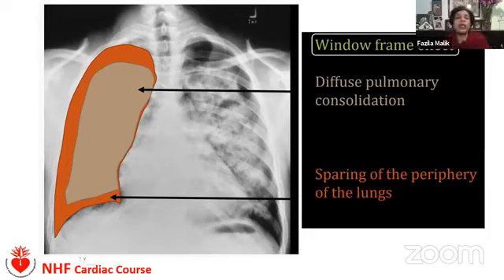One important thing about X-rays is that we really need to correlate these with our patient. In our day-to-day clinical practice, correlating an X-ray with our patient's history and other findings is very easy. In a way, during examination, it's a bit unfair because we're just being given an X-ray and we're expected to know what the diagnosis is. But if we see something like this, this could be a clue.